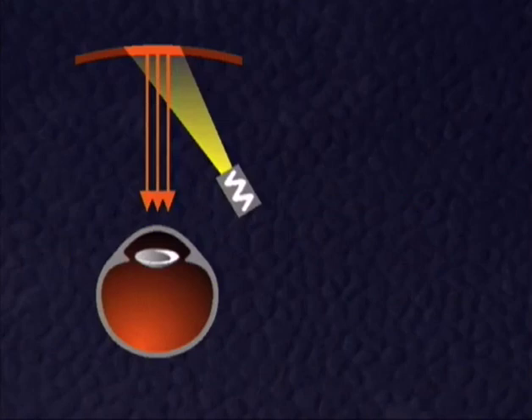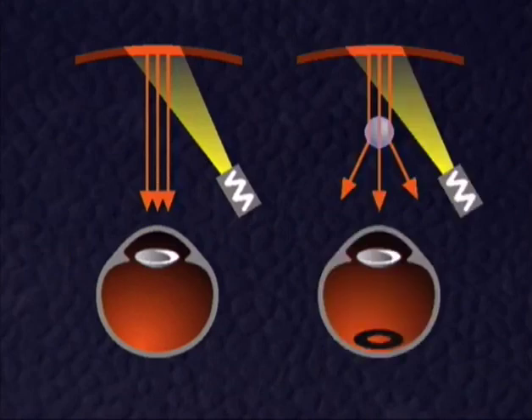When backlight from a distant light source arrives at our eye unimpaired, the observer sees an evenly illuminated background. When a transparent obstacle deviates part of the rays, these do not reach our eye and the respective area appears dark to the observer's eye.